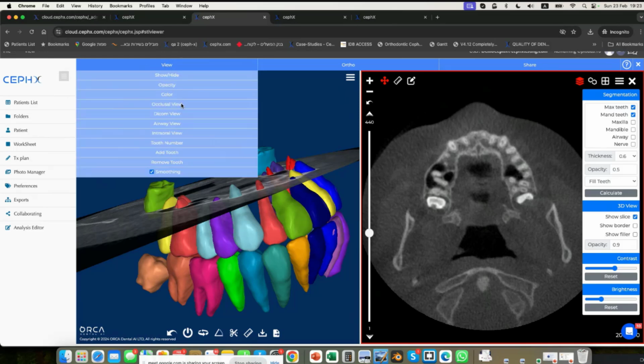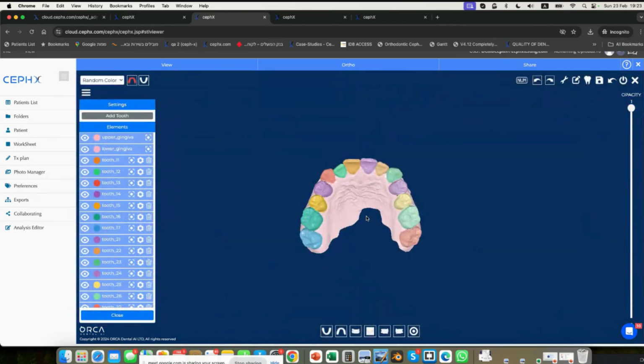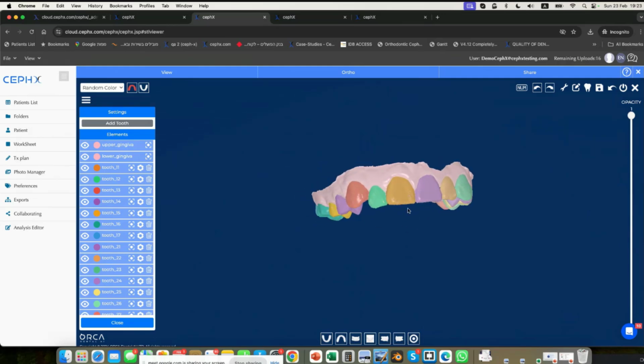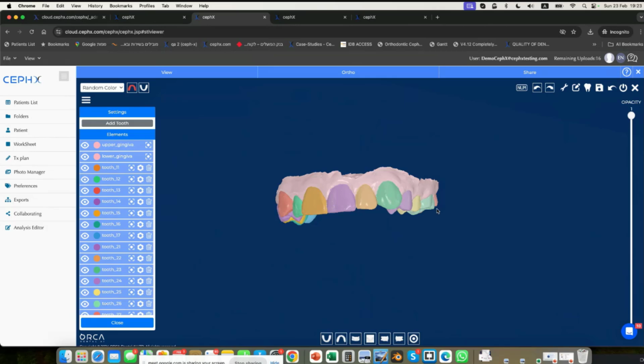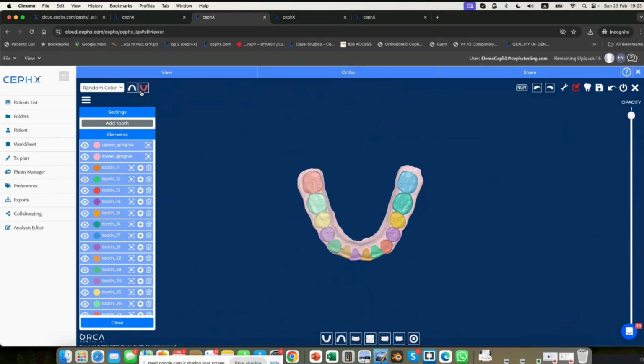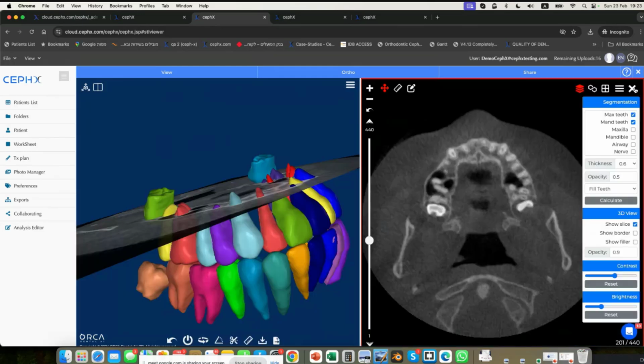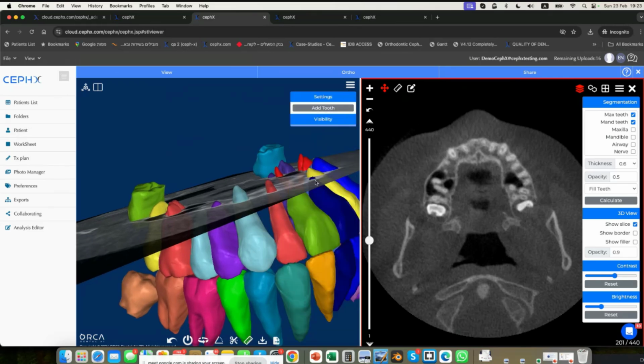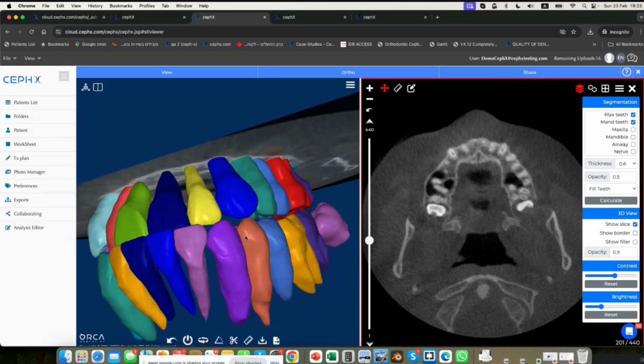We go to the intraoral view. You can see, so this was the intraoral scan that was uploaded, and the first thing we do is we automatically segment it. So we've got segmentation tools, and that's part of what allows us to do the meshing of the two. So we have the segmentation of the intraoral scan, and then we also have the stitching. Again, if I look at the stitch version, we can see all the stitched teeth here.